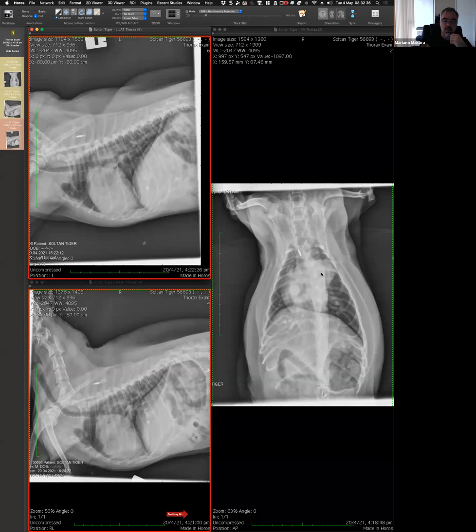So your comment, a good step forward, is that it is not the left ventricle, it's the right. So if it's the right ventricle, then we can put two or three of the findings together. Can you do that for me? Can you sell me the hypothesis of heartworm? Because I've never seen a clinical case, but I believe you would get enlargement of the right ventricle, and I think you would get enlargement of the pulmonary outflow area. I don't know why you would get enlargement of the veins.